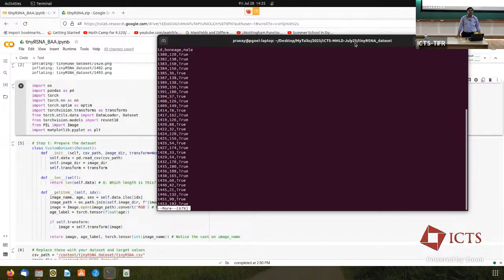So everybody knows about a pandas data frame. Who doesn't know what a pandas data frame is? Oh, most people don't know. Okay. So we will learn about pandas. CSV files are read by, as you would read Excel files, right? So you would have to have a facility to read a file in. I'll show you all of this in a minute, right? If you're feeling lost, I'll show you in a minute how easy it is to do all these things. We shall go to ChatGPT to find out.